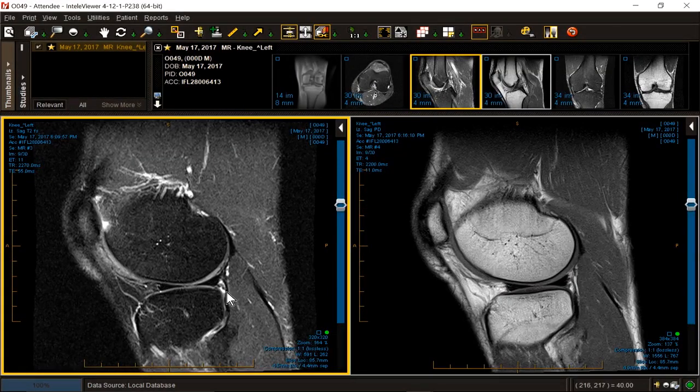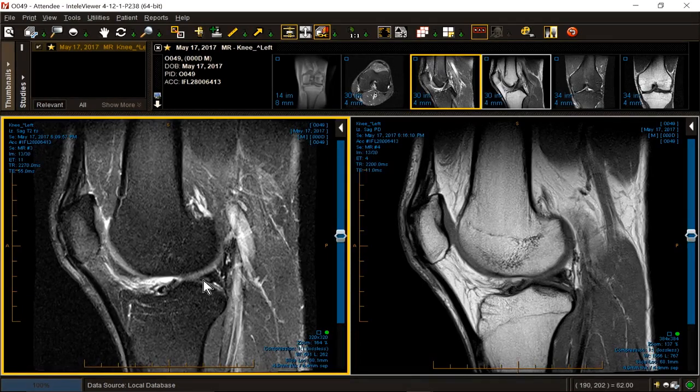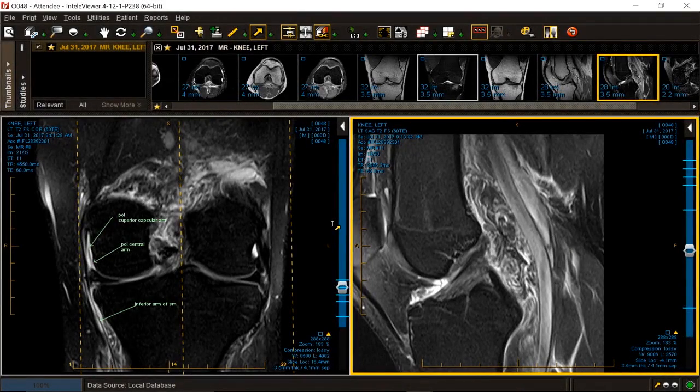So this is a fascicle injury, an isolated fascicle injury, leading to a secondary meniscal flap tear near the meniscal root, producing inordinate symptoms in a professional athlete. Tough case. I just want to finish off the knee with a final discussion of the posteromedial and lateral corner, and then some miscellaneous disorders of the knee, and then move on to the hip.